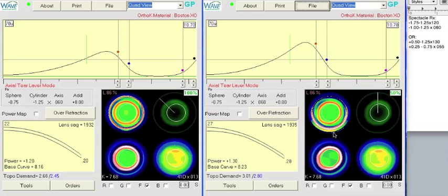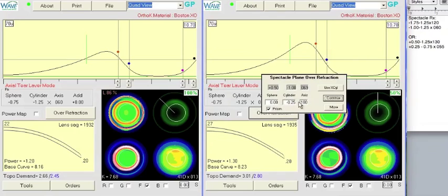the treatment zones. Back to the over-refraction, it really doesn't matter what axis you have. -1/4 is the smallest amount. And all this does is it changes the front surface optics on the lens. So it may affect the patient's vision with the lens on, but it'll be minimal. And all we're doing is we're adding that in there so that Wave puts prism ballast on the lens.